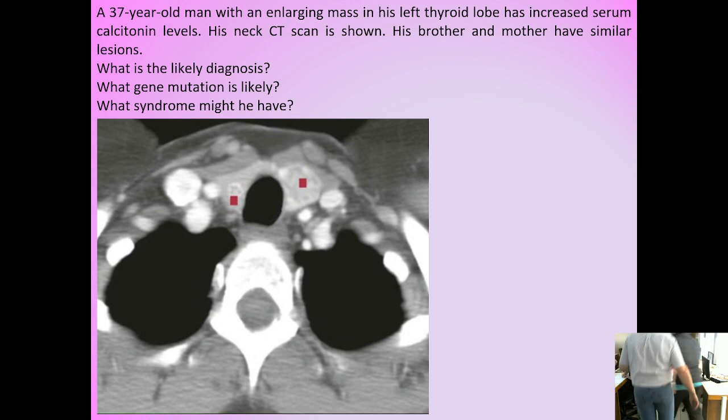We'll start studying cases of endocrine gland pathology. We'll discuss the images and take the basic principles of theory into account. So, the first, this is a CT from a 37-year-old man, and can we understand when you see something black, that means that it is air in it.